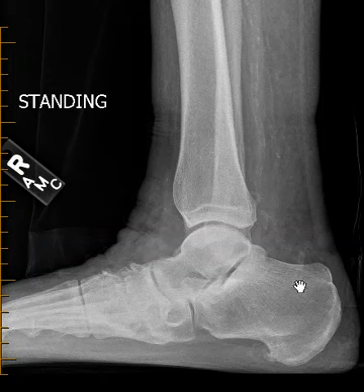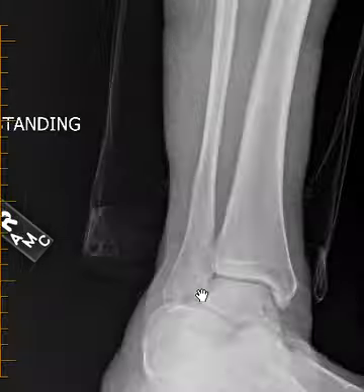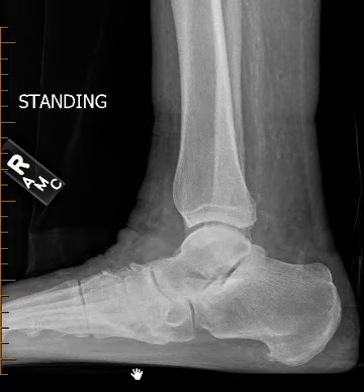It's chronic. They saw their doctor and they had x-rays here. It shows pes planus deformity, flat foot, and so they thought maybe they had posterior tibial tendon dysfunction with collapse of the plantar arch, and they did an MRI here to confirm.